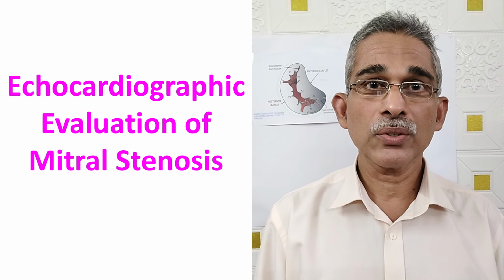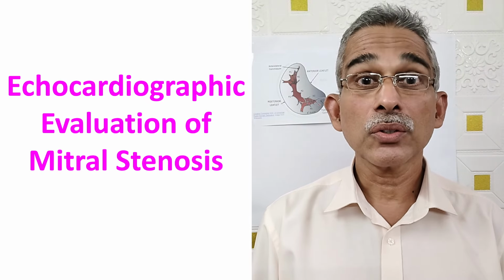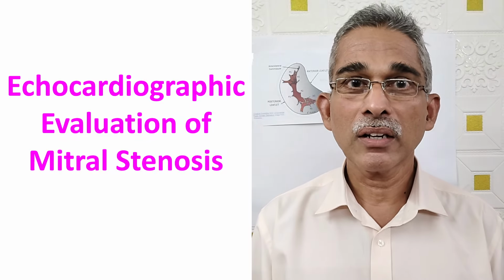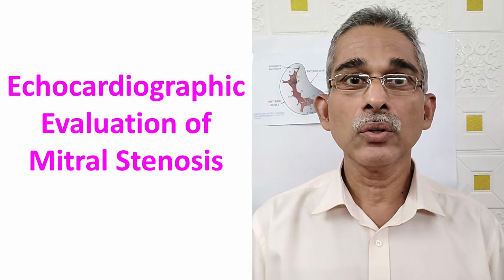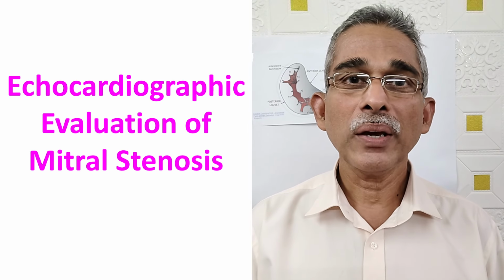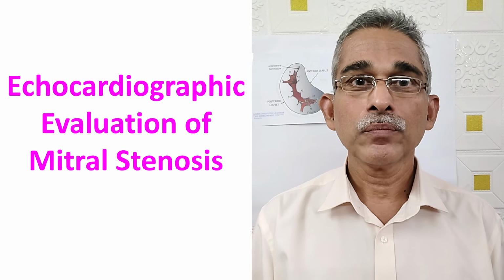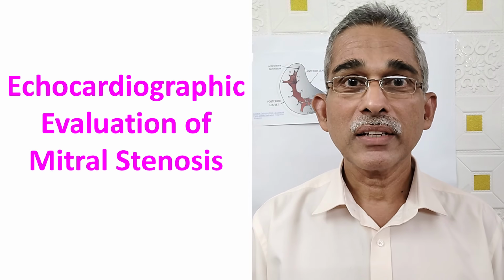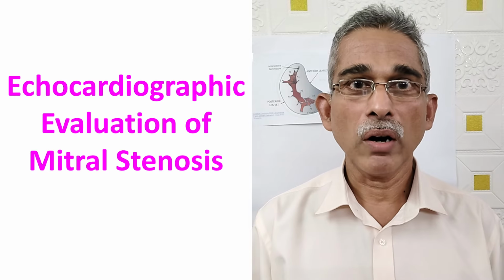Another variety of mitral stenosis is going to increase now, that is annular stenosis due to mitral annular calcification. Mitral annular calcification occurs in renal failure, chronic kidney disease, and many other conditions. In the elderly, it is more likely to appear in higher numbers as the population ages. Difference between rheumatic mitral valvular disease and mitral annular calcification is that mitral annular calcification is going to be more difficult to manage, while rheumatic mitral stenosis can be simply managed by balloon mitral valvotomy.